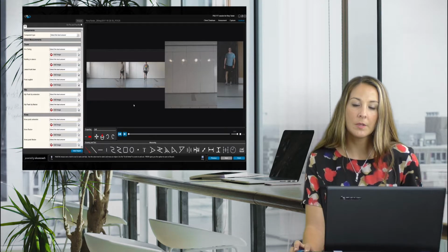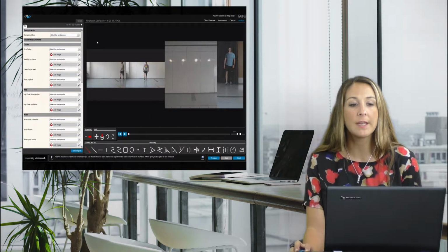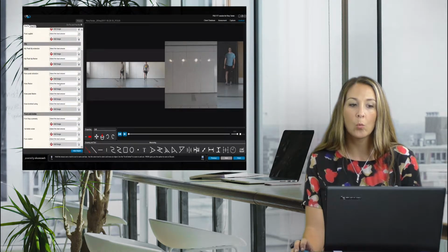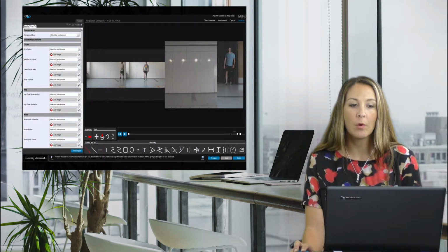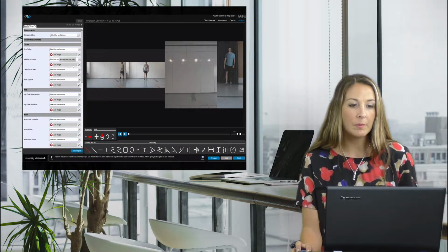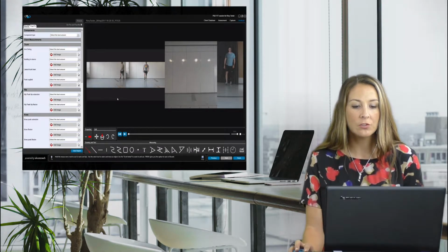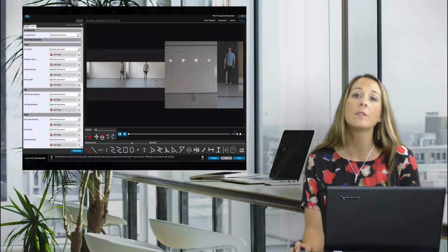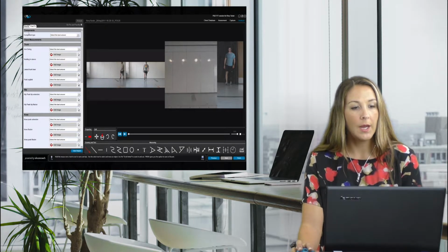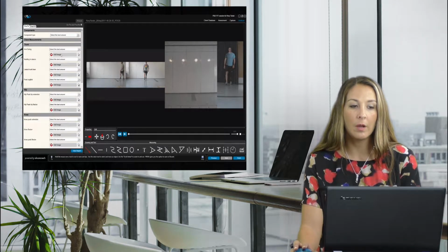And this is where we come to the pre and post fit video analysis. So there's a little tick box up here in the upper left that I'm going to click. And what that does is it allows me to fill out the report on one side and then fill out the report on the other side as well. So I'm not going to go through how to conduct a complete report. What I want to concentrate on is some of the cool tools that we have with the clinical movement data system, and how we can compile a report that shows us side-by-side comparisons.